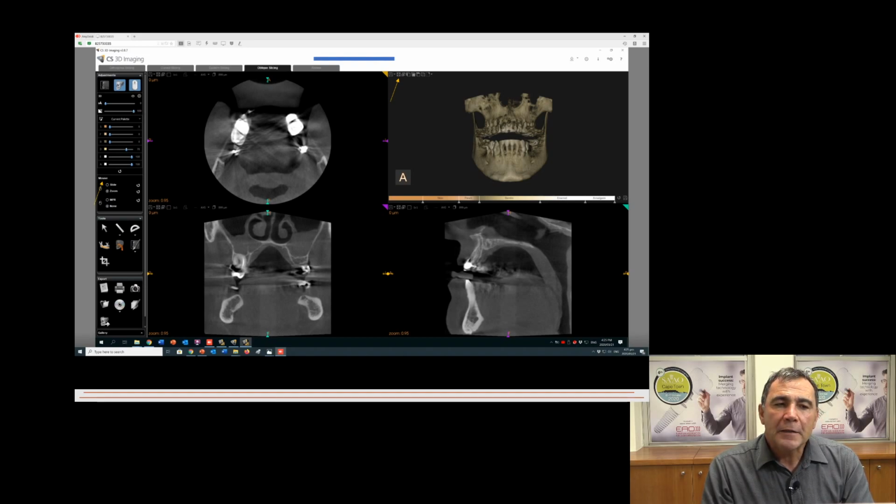And the buttons on the right hand side, because everybody will play around with these images and get totally lost. So do I. But the buttons, the circle with the arrow on the right hand side, revert to that and you get back to point 0.